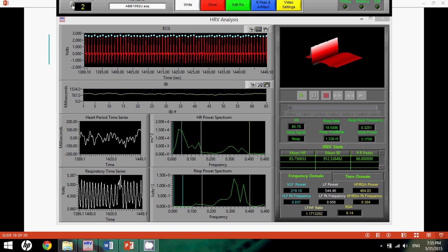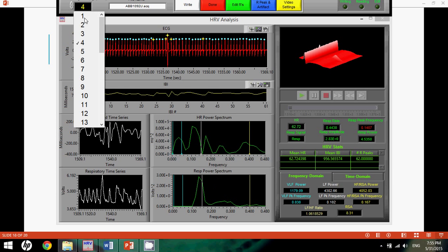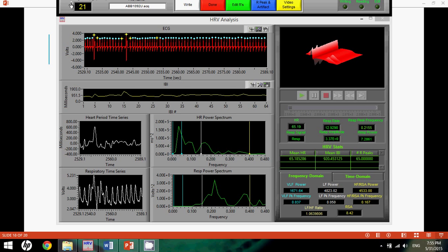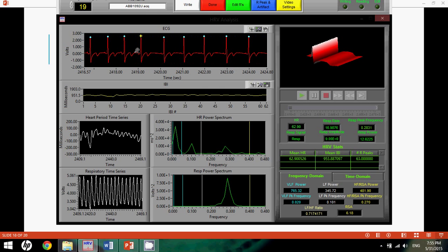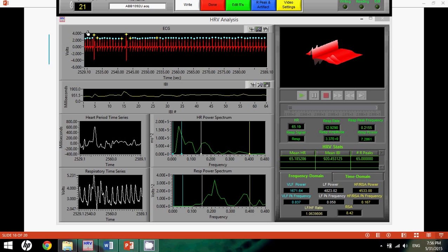This data, as we can see in segment 1 and also in 4 and 22, is pretty consistent, although this one's a bit different. Throughout all of this data though, we see these same cardiovascular anomalies. In some circumstances, they're manageable, in others they're not. In this case, for instance, it looks like it's just a very slight cardiovascular anomaly, or just an ectopic beat, if you will. In other words, it's natural physiological variability that is really not harmful to the RSA or doesn't cause any drastic leaps.